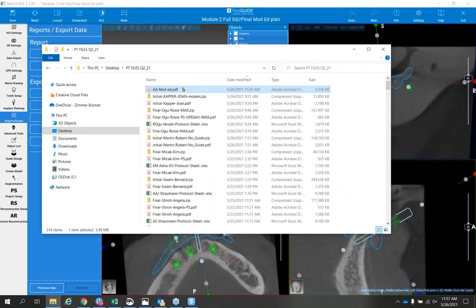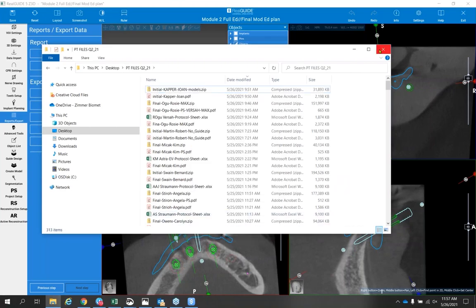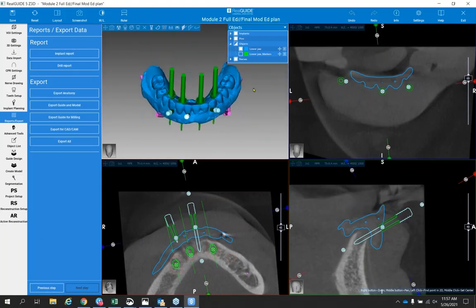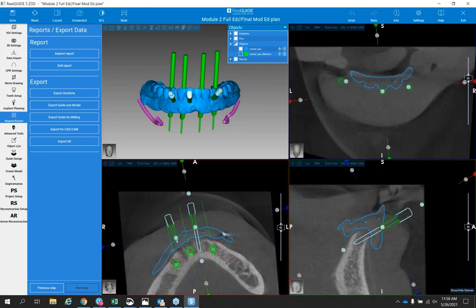All right, so I want to open it up to some questions now. I hope I gave you a thorough explanation of how to plan, how to bring in our dual scan prosthesis, that dual scan protocol, how to plan the implants, plan for our anchor pins, and then save and export this for guide production. It's really good software. It's very intuitive to use. It's just step by step. And if you get lost or make a mistake, you can always go back.